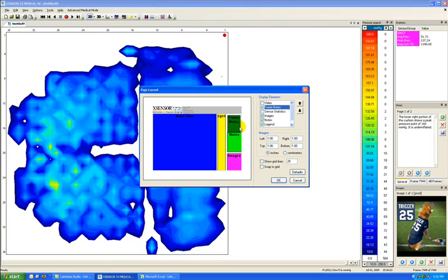So now all of my frame notes are included in that space and will be available on my printout. The page layout option is a great way of organizing information to create a single summary page of your pressure imaging session. So a way that's representative of all the work that you did, that you could hand off to a colleague, to show a patient, or to put in a file folder.